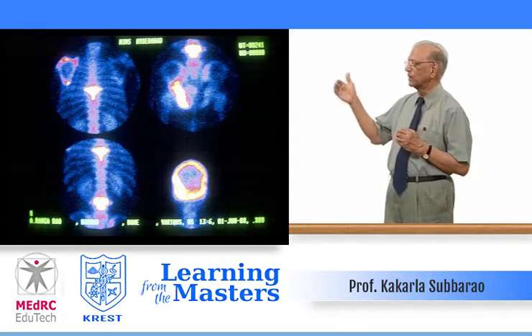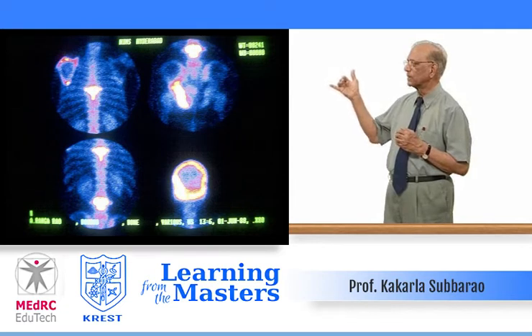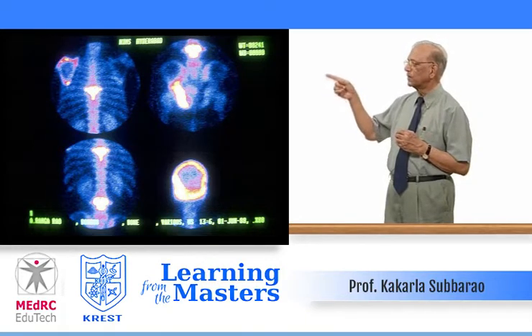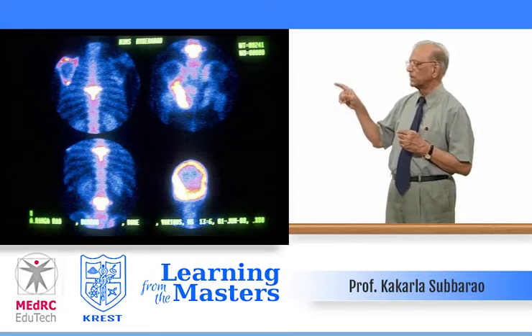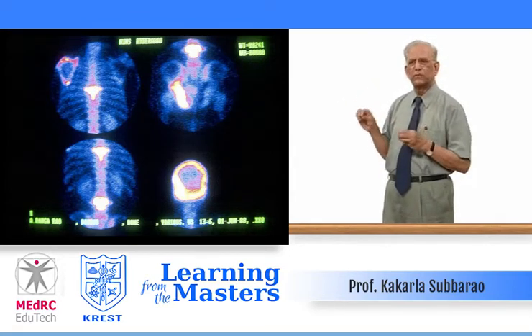Note the areas. One, the vertebral body in the thoracolumbar junction, and the entire calvarium, and the sacrum is also involved. And look at the iliopectineal line in the pelvis. Whenever that part is involved, immediately the specialist in the medical isotope scan comes to me, saying, sir, we'll take a radiograph of the bone just to confirm that it's pagetoid.